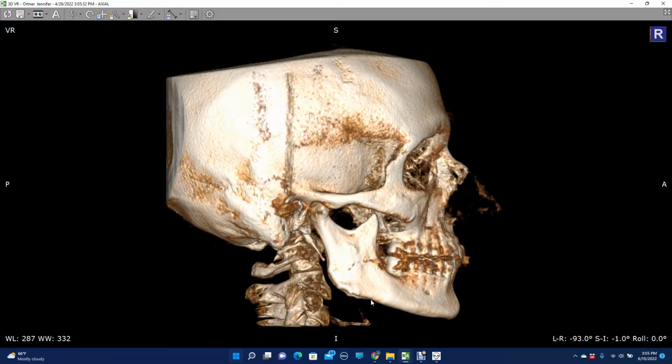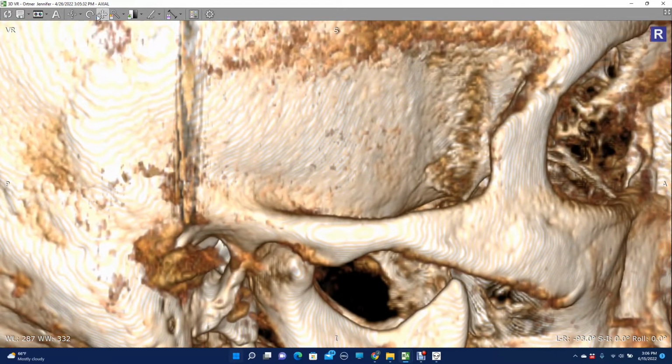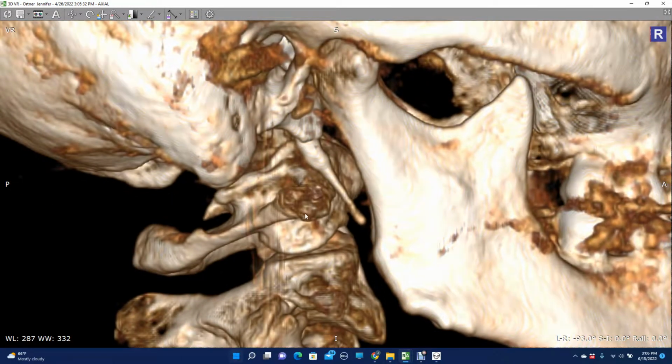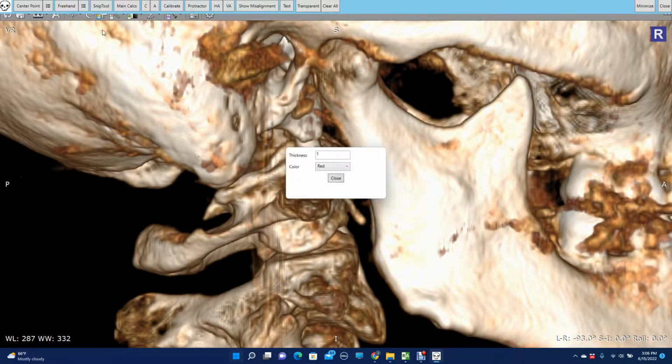Let's crop a nice lateral shot of their skull. We're going to zoom in, and we can see her TP there on the right side. If we open up the toolkit again, I like to use the freehand tool in a level 2 thickness, and I like to circle that transverse process. But I also reference the jawline, and I also reference the mastoid.